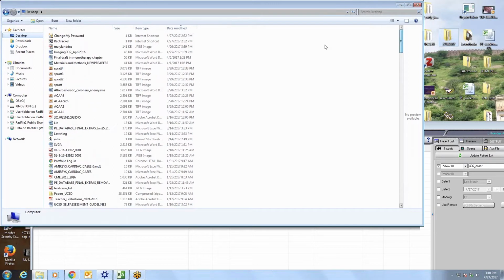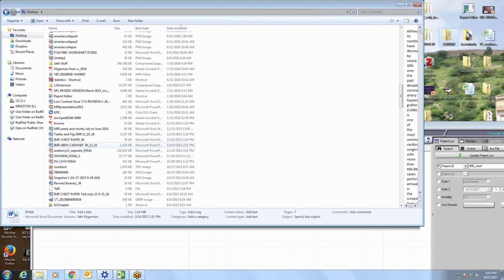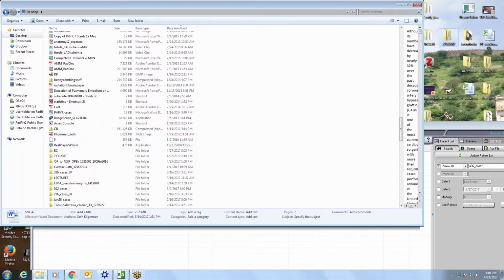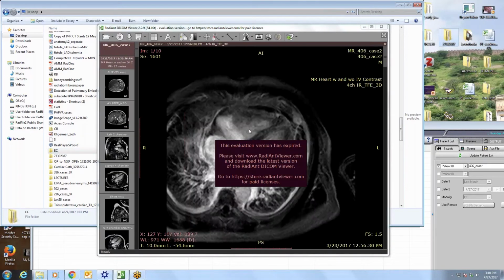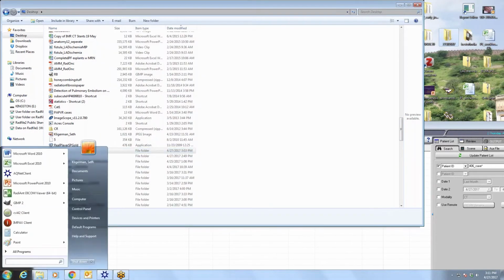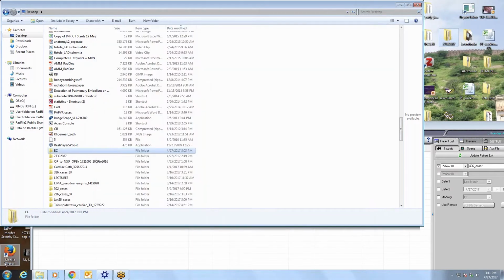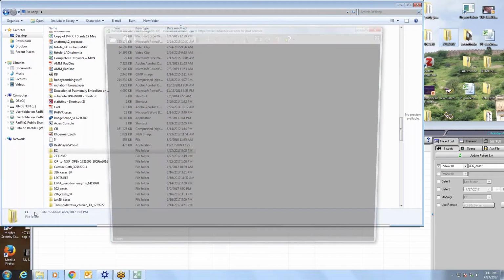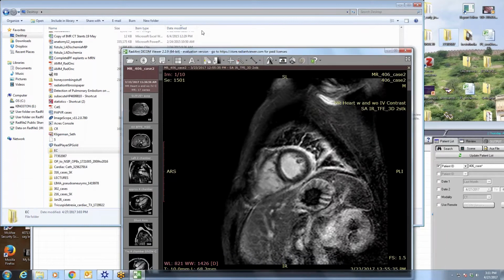Why do you think it's happening here in this patient? Why do you think we have this flow phenomenon? Brandon? I honestly, I mean, it's clearly an earlier arterial phase. Why? I don't know. I really don't know why that happened specifically in this patient. I guess there are differences in flow characteristics along the course of the aorta, and if you catch it at the right time, one part's opacified and the other is poorly opacified. That's all I know.